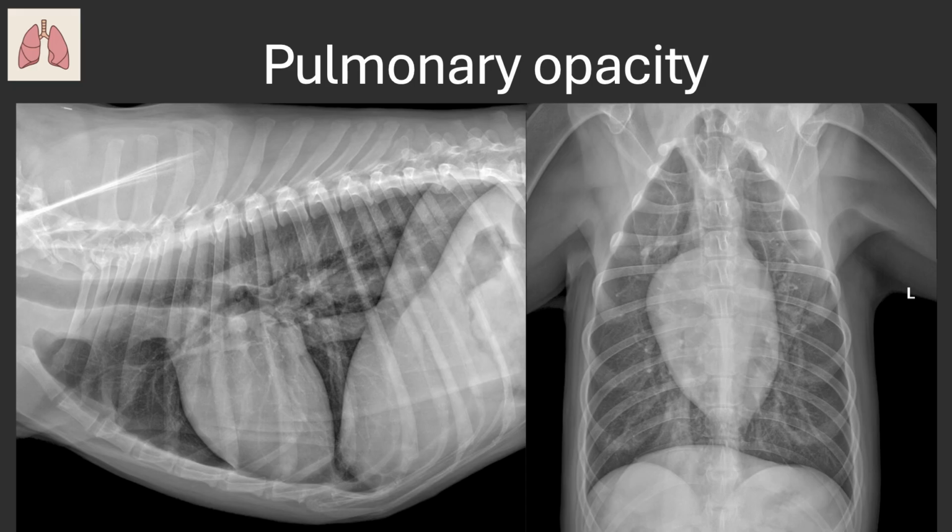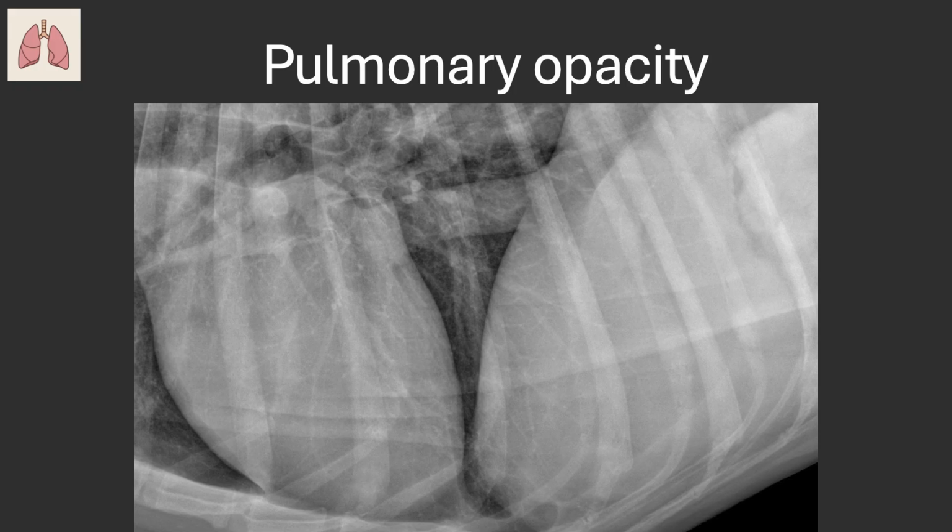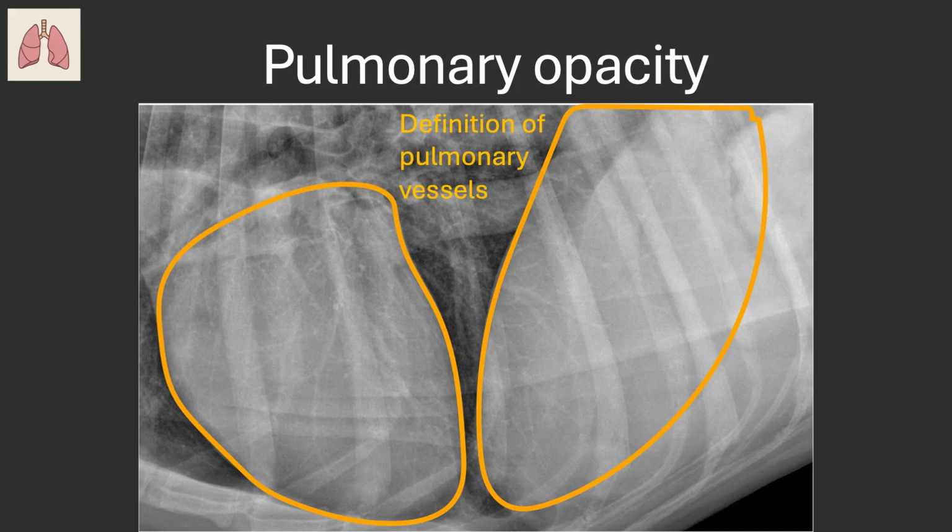As previously described, the pulmonary parenchyma is gas opaque due to gas filling of the alveolar spaces. In the region of the cardiac silhouette and superimposed over the diaphragm, it is more difficult to define the opacity of the lung. Both the cardiac silhouette and diaphragm are homogeneously soft tissue opaque, as noted by the regions outlined by the orange line. Normal gas filling of the pulmonary parenchyma is determined by identification of the well-defined pulmonary vessels that are superimposed over these soft tissue structures. These remain well-defined due to the contrast between the gas-filled lungs which surround the soft tissue opaque pulmonary vessels within the pulmonary parenchyma, as noted by the white arrows.